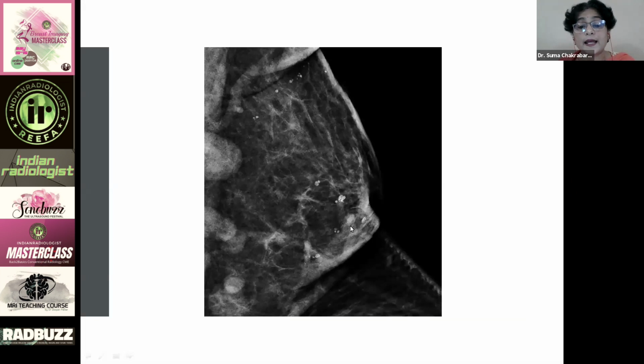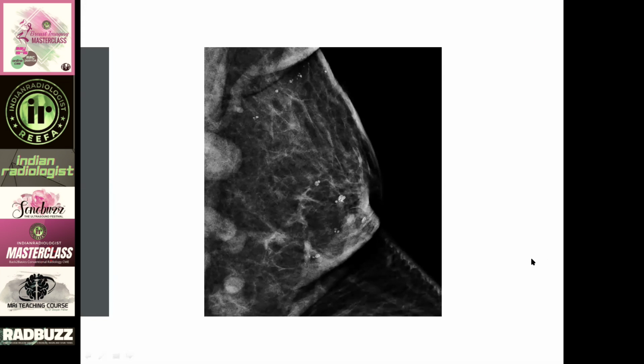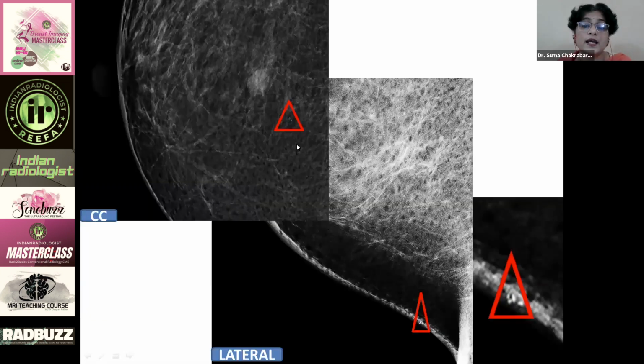They typically occur at the axillary region because, wherever there is a fold, the axillary region, the inframammary fold, the parasternal area or the medial part of the breast. So they can be grouped like this, small 5 millimeter groups of little calcifications with lucencies within them. These are entirely benign, BIRADS 2, nothing to be done about these at all. Another example, a few tiny microcalcifications, and you see here that they are actually in the skin on the lateral view.